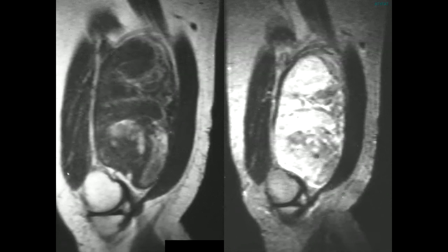Another patient with fat within the lesion, which of course now is only a small percentage of the lesion in this large, otherwise fairly non-specific mass, seeing the fat being intermediate on a non-fat suppressed T2 weighted image, allowing us to make the diagnosis of a liposarcoma. And of course, myxoid liposarcoma being the most common, representing about 75% of those seen within the extremity and demonstrated here.